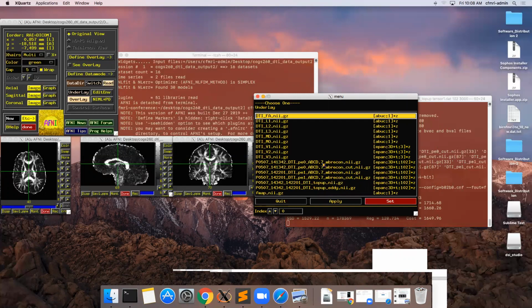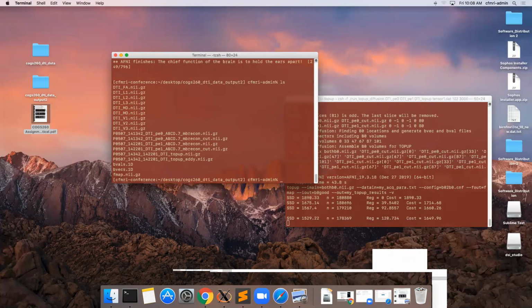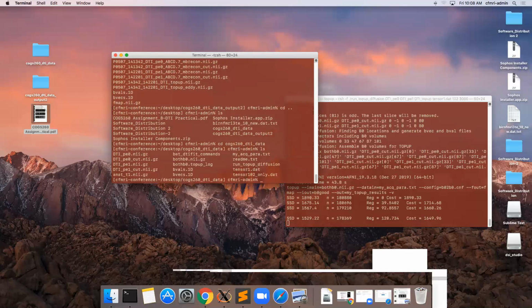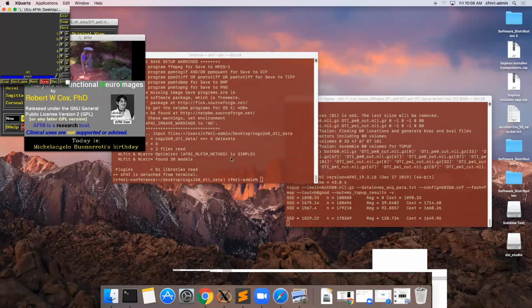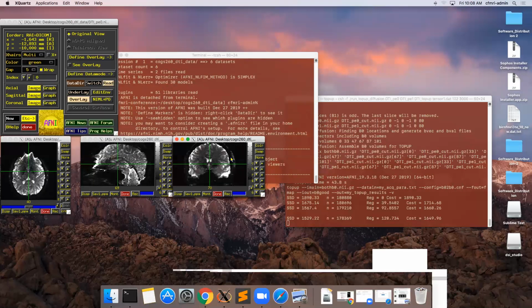All right. So the data sets, let me go to the data set you actually have. Which one I sent. This is the one that's already been topped up. This is the one that has not already been topped up. This is the first data set that you pulled. Okay. And it's currently running right now in this directory, which is why there were some extra files in there. Yep. But it has not finished the TopUp process.